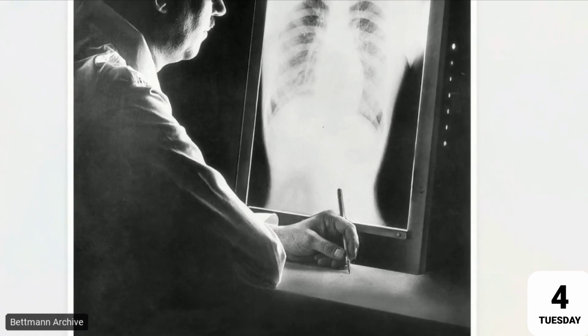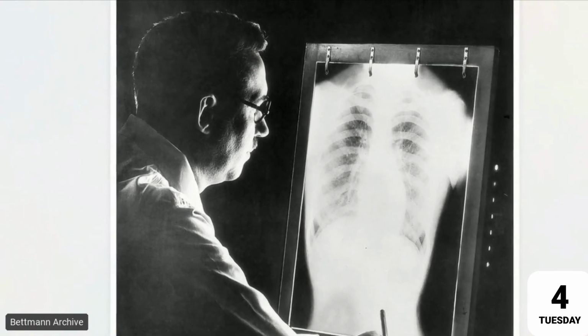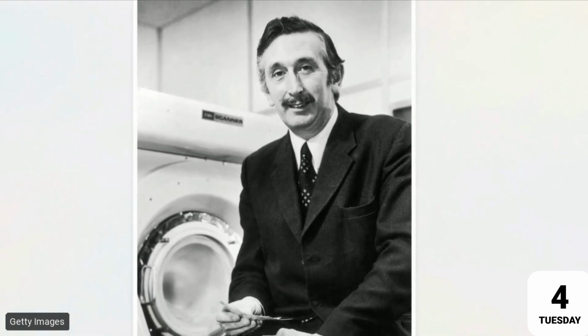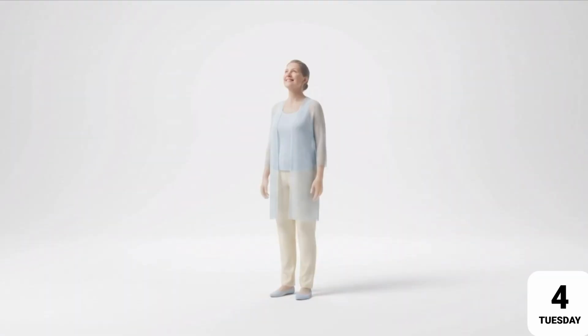Before the 1970s, neurology relied heavily on clinical deduction, forcing doctors to guess at pathologies hidden beneath the bone. Then, engineer Godfrey Hounsfield developed the first commercial CT scanner, allowing medicine to see inside the skull with exact precision. The CT scan serves as a real-time, three-dimensional survival map, decoding the complex geography of the human brain to save millions of lives every year.